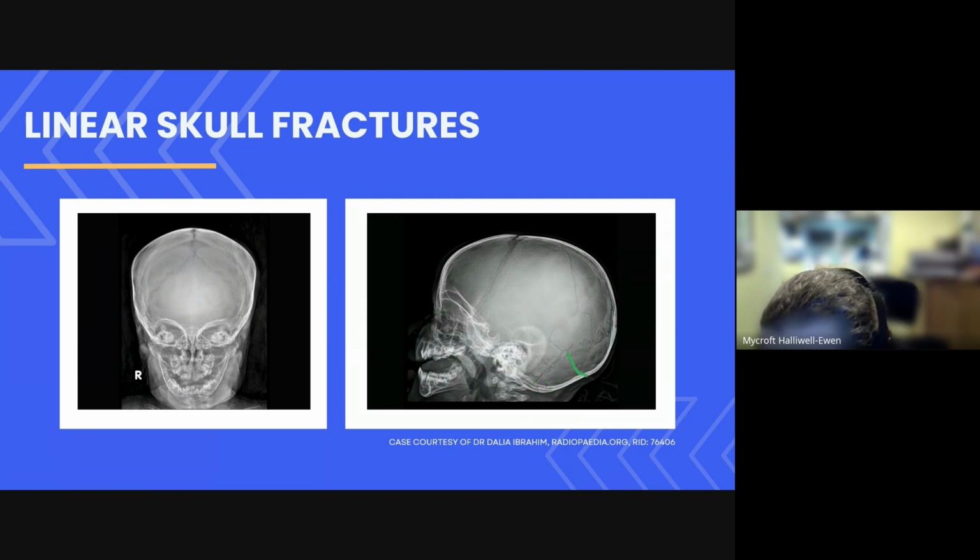What you have to be careful of is not interpreting this suture as a skull fracture, although I think this is fractured through that suture. And this, I think, is also a fracture, but it's very near to the suture. I think that because you can see a break in the cortical bone up here. Everyone with me? Multiple linear skull fractures.